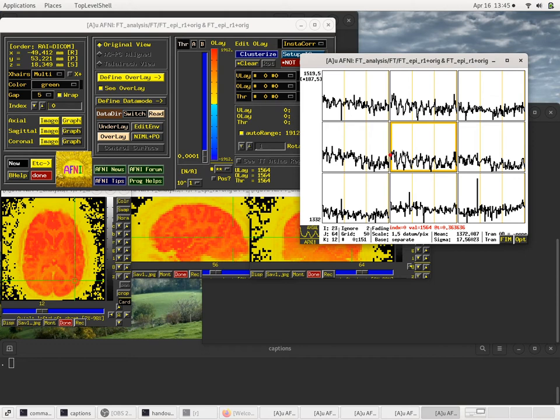You've lost the numerical resolution in the data, so it's probably not going to work out for you very well for such an analysis. So you'd like these original numbers to be big, preferably over 1,000, but if they're 500, say, that's okay. That's a numerical resolution of closer to 0.2, which is still not great. But okay, this looks good.